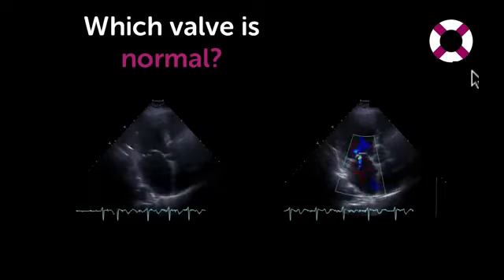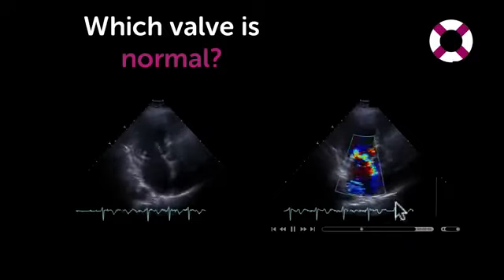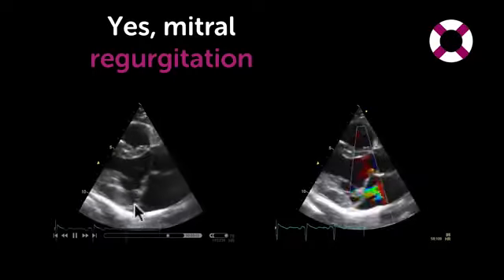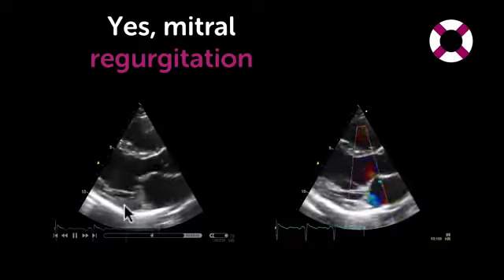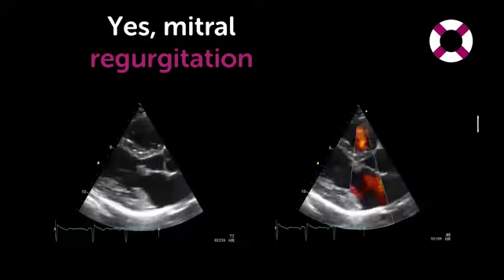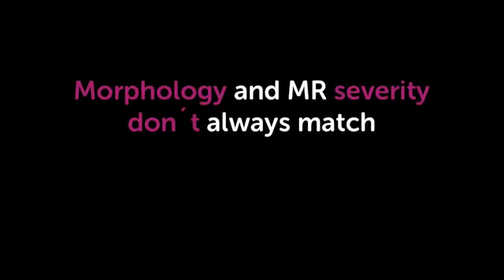You can have very subtle defects. This is almost a defect you might miss, but still very severe mitral regurgitation. Compare this with this patient here that I showed you previously, where you have significant valve abnormalities, but in reality not so much mitral regurgitation. So morphology and MR severity don't always match.